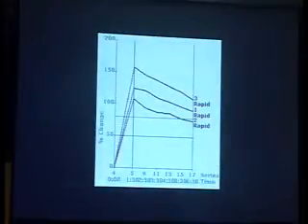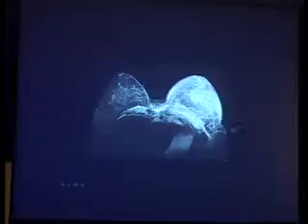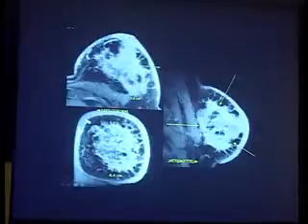These are curves. These are classic type 3 washout curves, going up but then quickly going down because of the principle of angiogenesis. Very similar to what was discussed with contrast enhancement mammography. And this is more in the chest wall area, just showing that there's likely involvement of the chest wall, as shown by the enhancement here. Okay, that I'm pointing to.